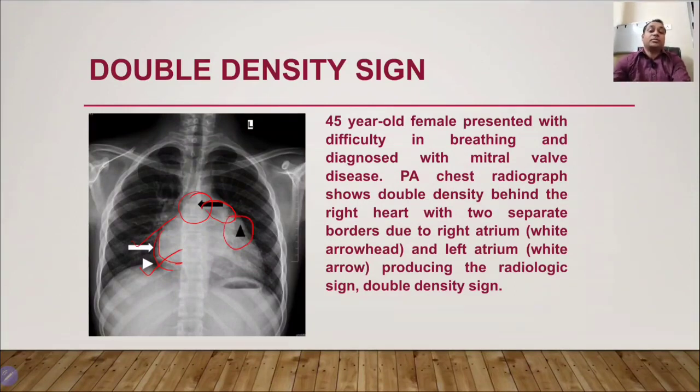This is all about the double density sign. I hope you all understand what is double density sign, and you will be able to identify the double density sign radiologically, and this will definitely help in the diagnosis.